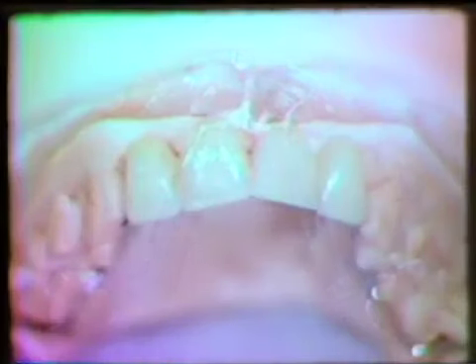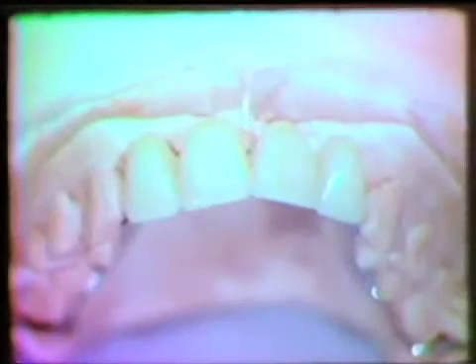The minor connector coming off of the cuspid rest swings away from the tooth to expose as much gingival tissue as possible. As the major connector extends posteriorly, it remains more than 6 millimeters away from the gingival tissues. For this patient, the determination was made to simply butt the teeth against the labial surface of the anterior ridge without the use of an acrylic flange.